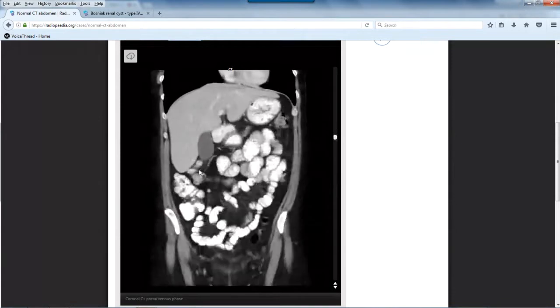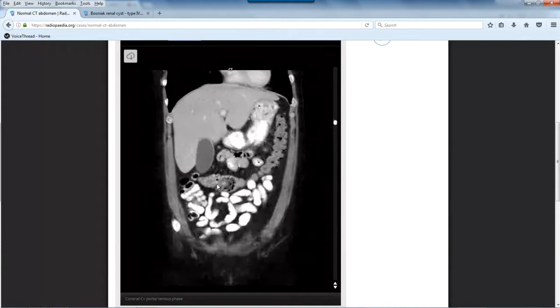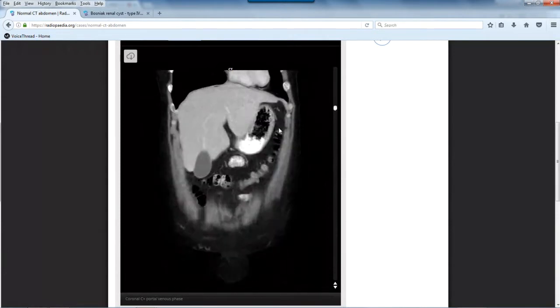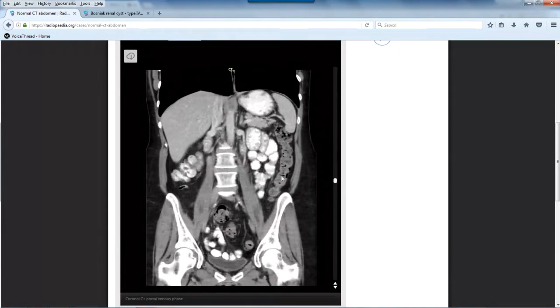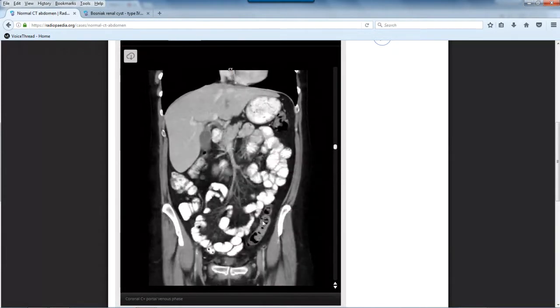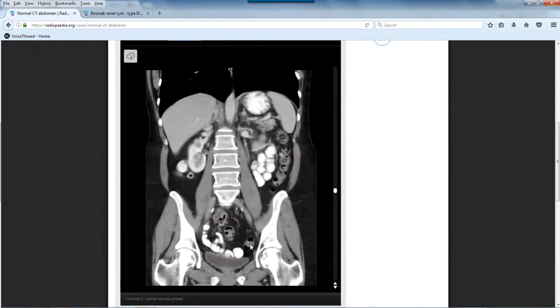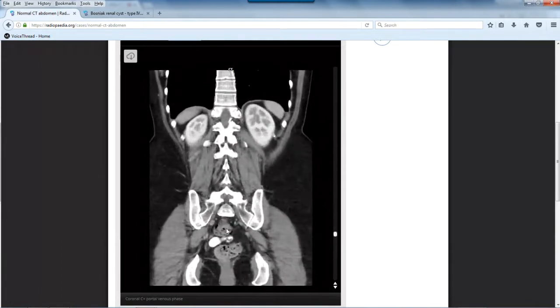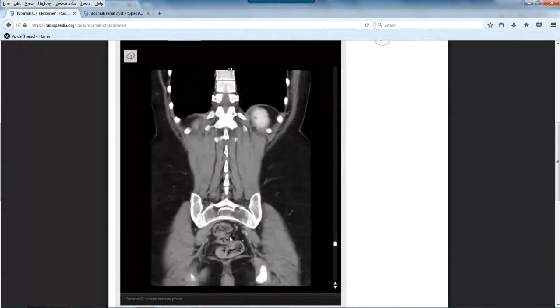Here it kind of looped, it kind of went down. It was like redundant. Did you see that? So it goes up and then it kind of goes redundant down. Here's transverse. Up to our splenic flexure over here. And then now I'm going back down. Here's our descending colon, see? And now it's kind of going anterior again when we hit the sigmoid. Here's sigmoid here, a little anterior. And then it goes a little posterior. Sigmoid comes across. And here's your rectum right there, okay?